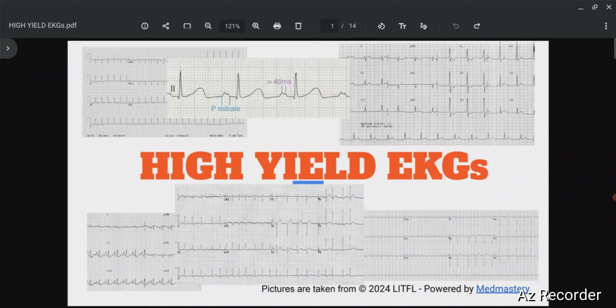So we are actually starting a new series in which we will be discussing high yield ECGs that you need to know for your exams in Step 1. In these videos, I won't be teaching you the whole pathophysiology of the diseases. I will only be telling you some tricks that you need to know to diagnose the ECG.